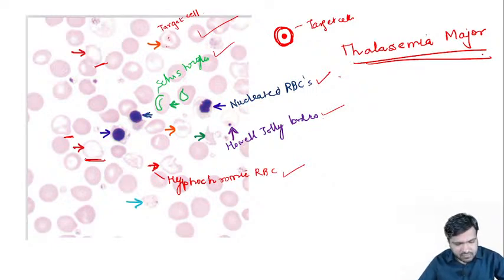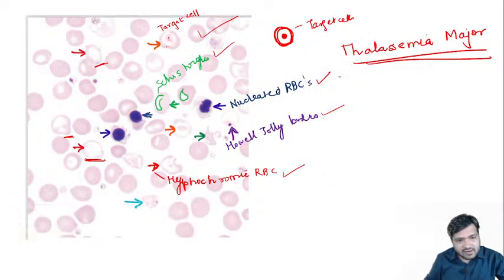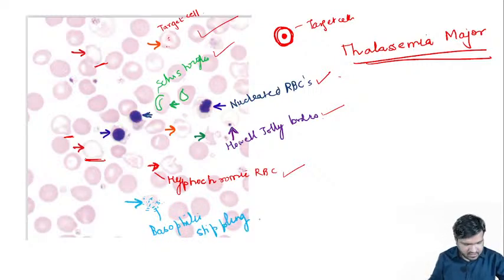Okay, apart from that, guys, in the blue also, it's not more clear, but I'll just try to highlight that ये जो last वाला जो blue वाला structure है, you will be able to appreciate the basophilic stippling as well. So yeah, it will be the basophilic stippling that will add on to these particular features which I have already displayed, guys.